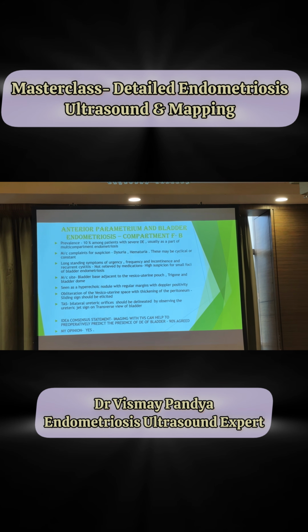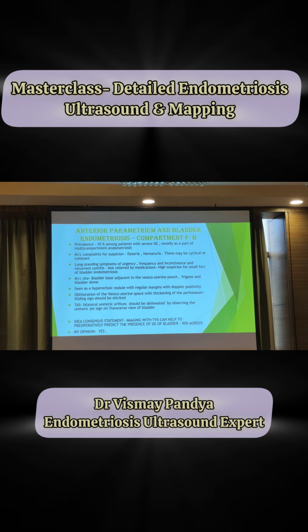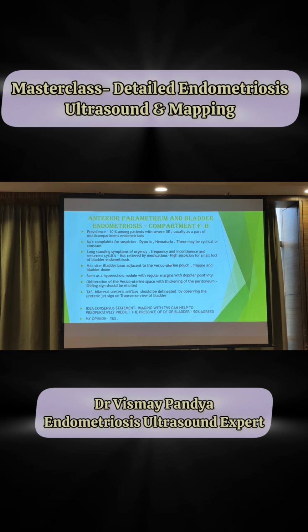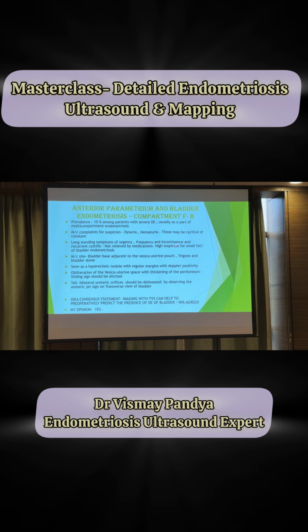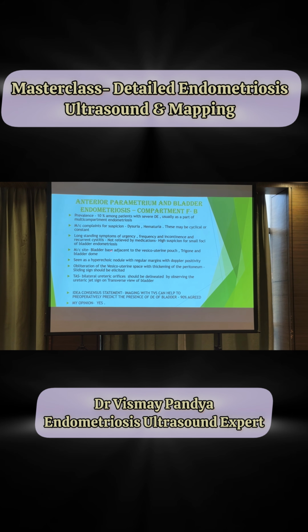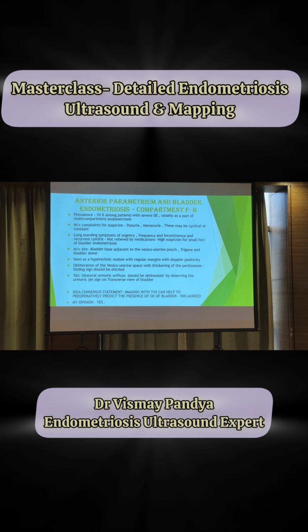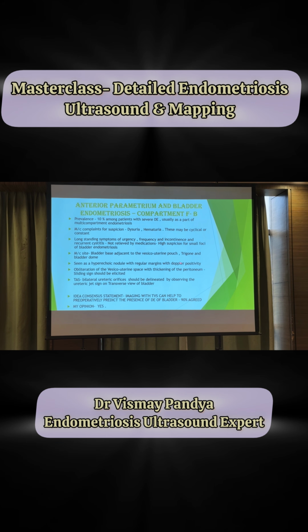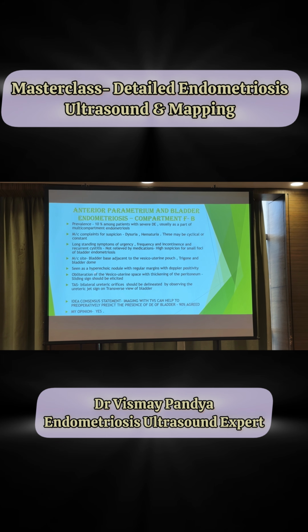Okay. Now coming to the anterior parametrium. Anterior parametrium, most common is the bladder endometriosis, dysuria and everything, long standing, most commonly bladder base adjacent to the vesicouterine pouch, trigone, and the bladder dome. It can be seen as a hyperechoic nodule with regular margins and, of course, Doppler positivity.